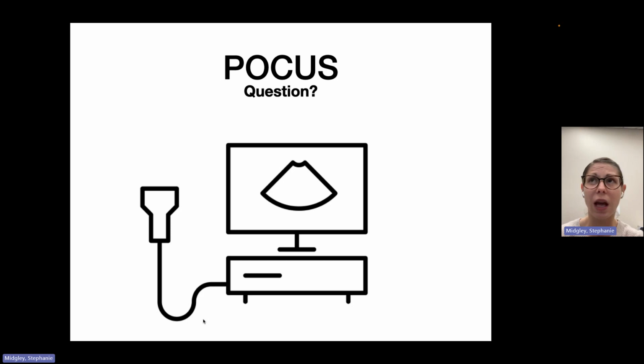If it is an abscess, how deep is it, right? So what's the depth of it? What's the extension? And where does that posterior border lie? Does it just end here, or is there a little tunnel and I'm looking at maybe an osteomyelitis that's tracked to the surface? And then what structures are around it? Is there an artery laying right on top of it where it might not be such a good idea to cut into it? Also very important things to know.